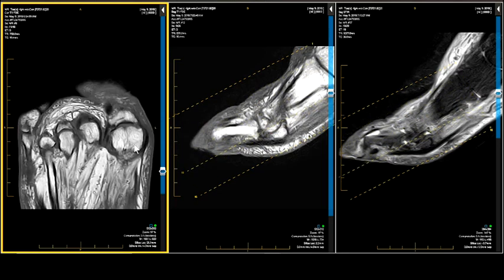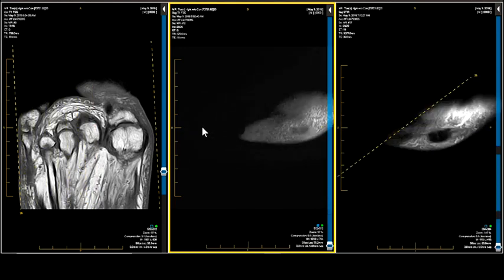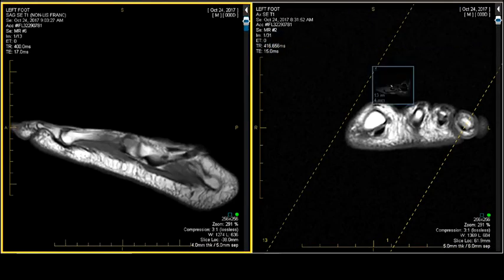But you've answered the question really quickly, actually. All you needed was the sagittal and the axial T1 to answer the question. Maybe one water-weighted image. Okay, let's do another one. Trauma. Now with mass on the bottom of the foot in a 53-year-old man for 2.5 months, and it's growing and it hurts. Let's go right back to our sagittals, the old lateral radiograph.